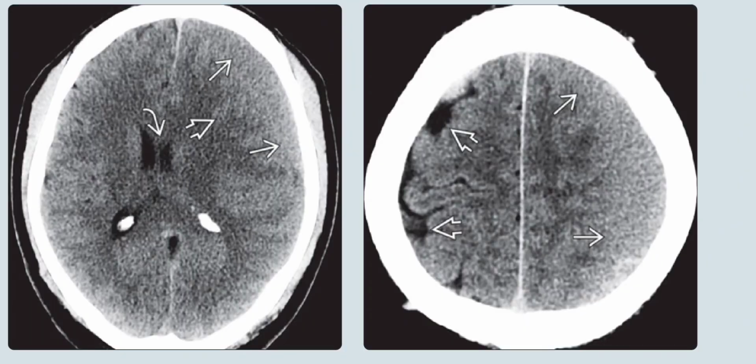Left, occasionally acute subdural hematomas are isodense to the underlying brain. Note the acute subdural hematoma with mass effect, inward displacement of the underlying gray-white interface, and left-to-right subfalcine herniation of the lateral ventricles. Right is a more cephalad non-enhanced CT scan in the same patient, and it shows the isodense acute subdural hematoma. The underlying sulci are completely effaced. Compare this appearance of the absent sulci with the normal-appearing CSF-filled sulci over the right hemisphere.